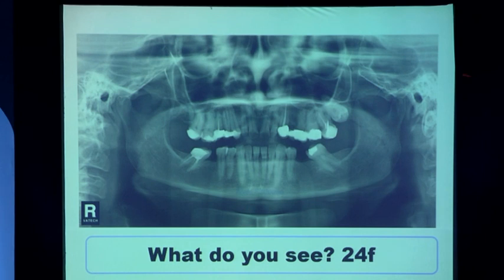You see external acoustic meatus on either aspects. Good. This is a routine investigation and a routine finding. The patient is not associated with any signs or symptoms of pain or discomfort in any parts of her face, neck, or the mandible or the jaws. When we're looking at the external acoustic meatus, we follow down. What is this? This is the styloid process. And then in this patient, incidentally, there's a variation of bifid styloid. The styloid is not single, it's bifid. There's a small styloid here, plus there's a long styloid here. Bilateral.